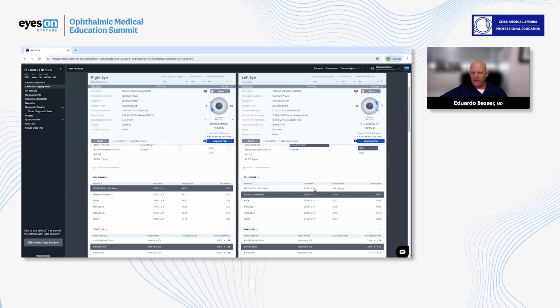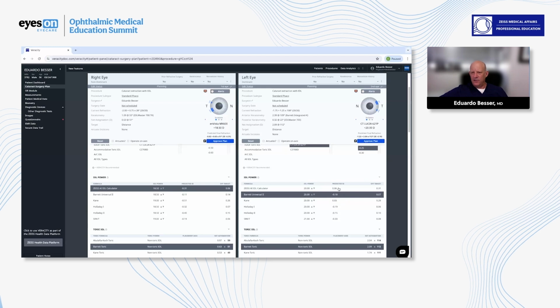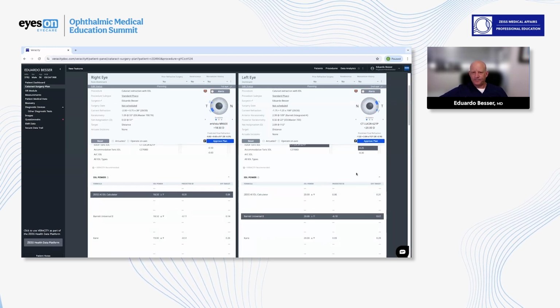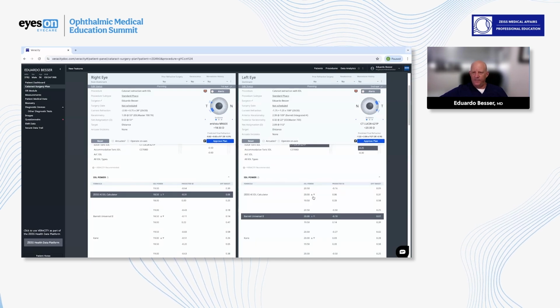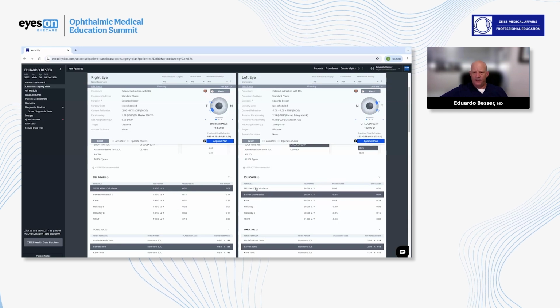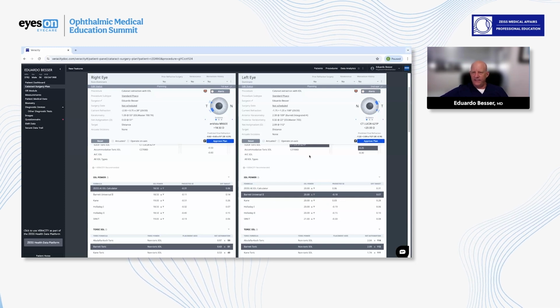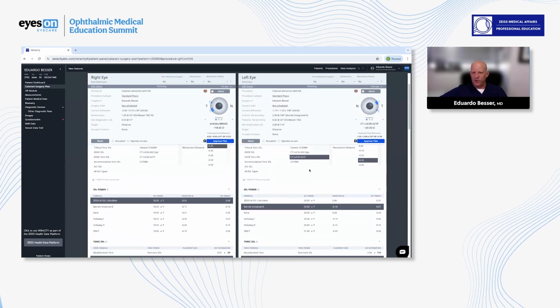Well, I can say, okay, what would it be if it was a 20 diopter? And same thing with Kane. So now I can get a sense of these three. I can also expand that, and this will show half a diopter above and below. And so you can decide, okay, I'm pretty comfortable with Barrett, but do I want to start integrating Zeiss? Do I want to start integrating Kane into my calculations? And later on, we'll see how you can have a data analysis to look at your outcomes without you really having to do much work.